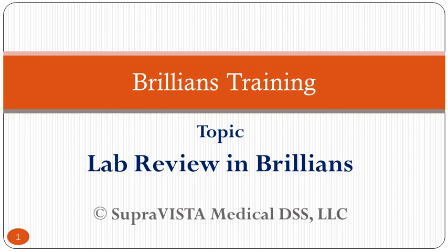Brillians is the new name for the application previously known as SupraVISTA. Today's topic is Lab Review in Brillians.